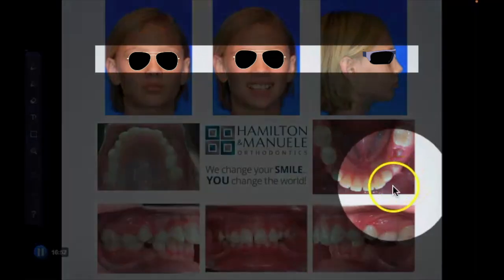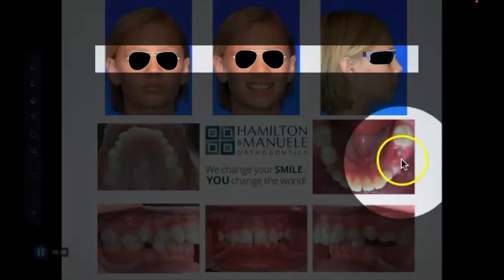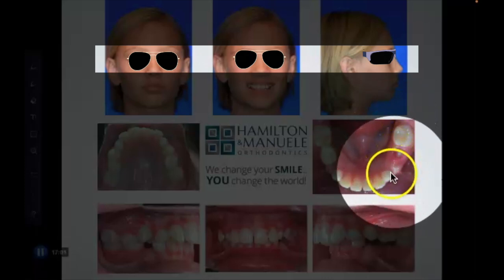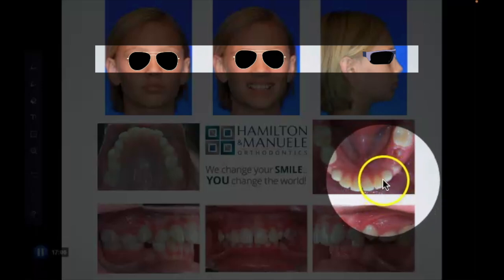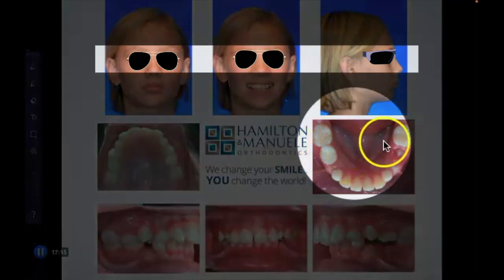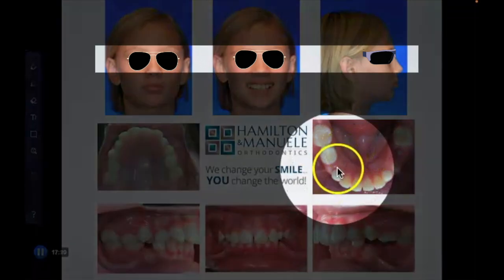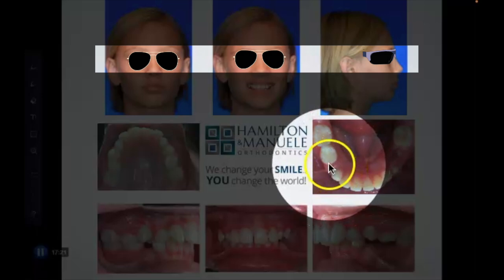Now we look on this side. We have the primary canine. You can imagine primary first molar, primary second molar. You can see that second premolar coming in, so that's good. Hopefully that comes in and helps keep this molar back without drifting forward. You can see there's probably enough room for the first premolar here, and then the canine, to be pretty close. On this side, maybe there's slightly more space loss. Hard to say. The molar, looking at the photo, could possibly be a little bit more forward. But overall, it's going to be pretty close. You can see we definitely have lost some space. A primary first molar would not fit here, correct?